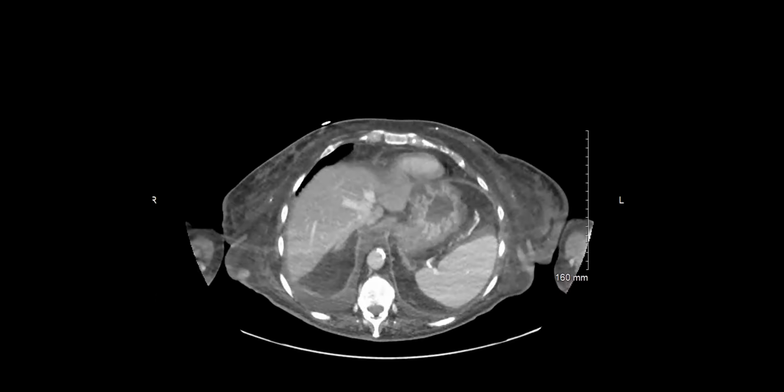This is apparently very uncommon. I've never seen this before, but this looks like gangrenous cystitis. It looks just like gangrenous cholecystitis, with full thickness non-enhancement. Gangrenous cystitis is super rare because normally patients get diagnosed and treated way before they get to this stage. We're not sure exactly what happened in that rehab and why she missed out on care so much, but that's what we think it is.